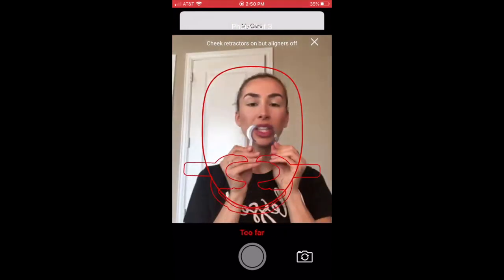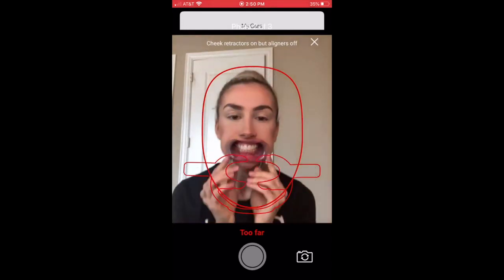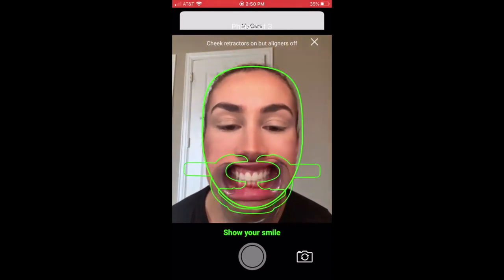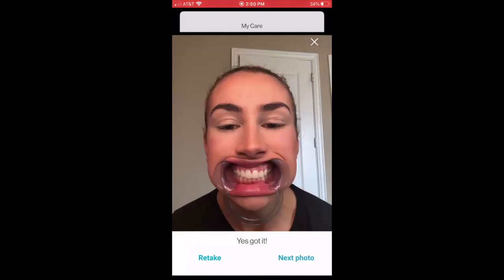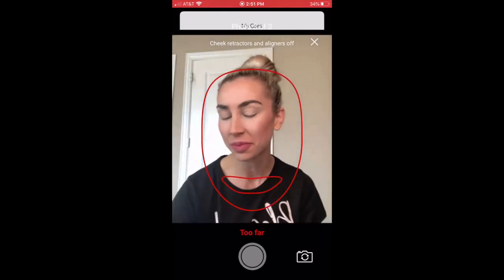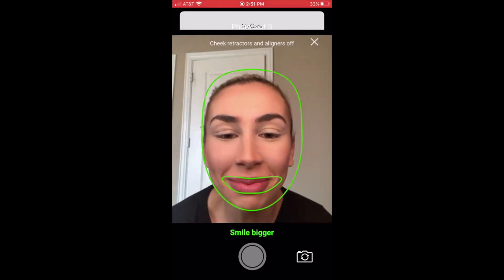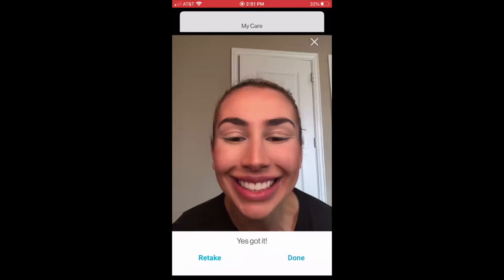Okay. Same thing. Yeah, you smile. They look oblong. Weird. Okay, and so no cheek retractors, this is just normal. So I can see your smile line and the edges of the teeth and everything. Look how pretty your teeth look. Yay. Look at my crow's feet on my eyes, though. Oh, stop.